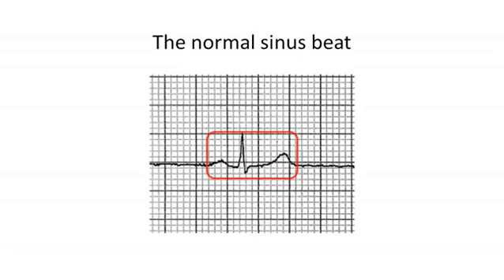and the ventricles. There are a wide variety of different measurements which can be taken to examine the waveforms and their relationships in greater detail. However, we are just going to briefly look at two of these which are of particular significance.